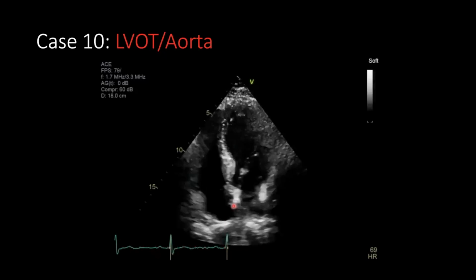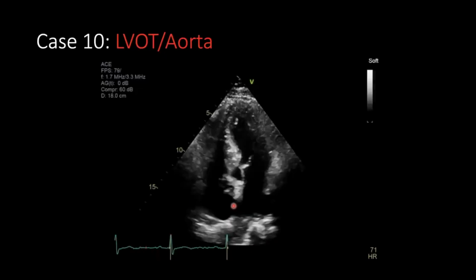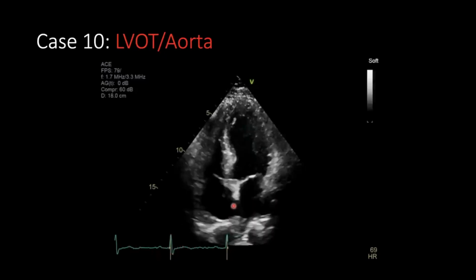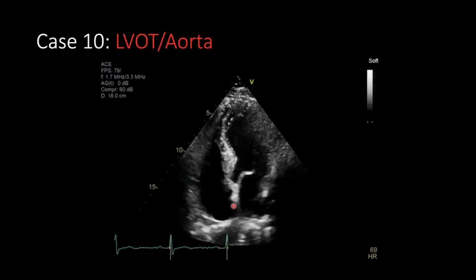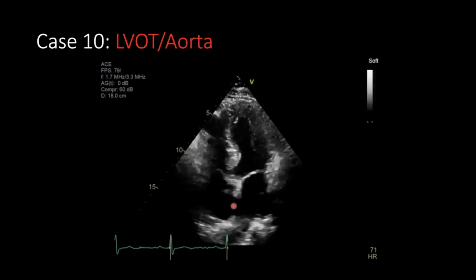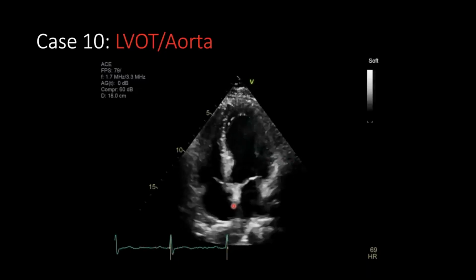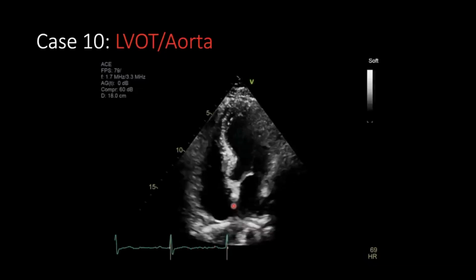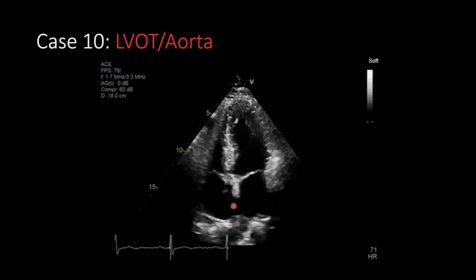Well, I also have a plea because sometimes I see this, it's between the five and four chamber views, and someone actually takes a picture of it, and then we spend a lot of time trying to figure that out, because often the aorta comes out and when you only cut part of the wall, it becomes like a mass in the left atrium or somewhere around there. Or right atrium. So if you actually do see it and you think as a sonographer, this is not a mass, after you had the privilege of scanning through it, please don't record that picture because it gets very confusing. You have only one. That's exactly what they did here.